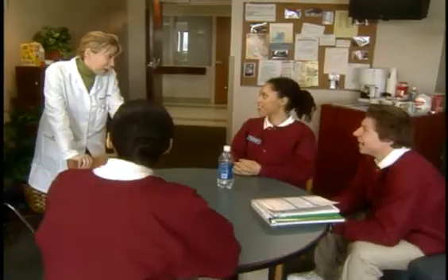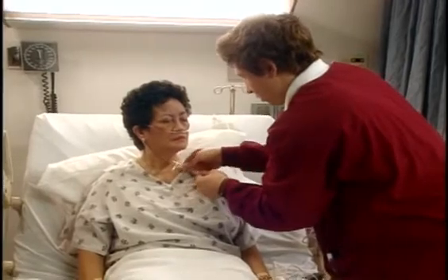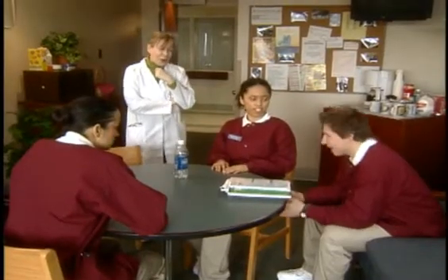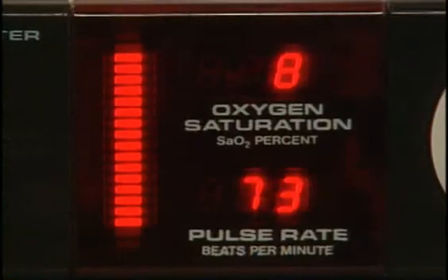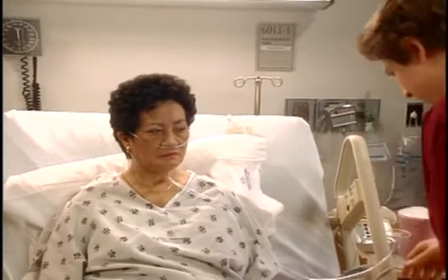Good job today. Now, Mark encountered an interesting situation. Mark, why don't you tell them about it? Oh, well, this was a little crazy. At the beginning of my day, I was assessing my patient's respiratory status, including her oxygen saturation. Now, she was receiving oxygen by nasal cannula at 2 liters per minute, and she felt fine. No shortness of breath, no other problems, and my assessment didn't reveal any acute distress. So, is there a problem in this? Right. Okay, here it is. The pulse oximeter read a low saturation level of 88% with irregular meter pulsations.